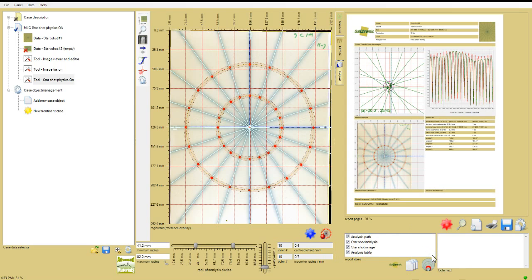To save the report layout as a template, or recall a saved report layout, click on the Report Options icon and choose accordingly. If changes to a report format or layout do not update, click the big red star icon in the report panel to force an update. Finally, print or save the report using the familiar icons.